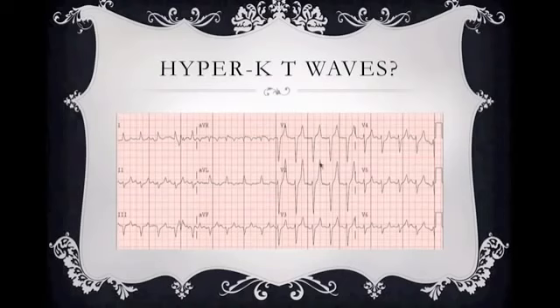Also looking at this T wave, we're noticing another thing. We also notice that we have a slurring up here of our ST. It's not flat, it's not straight across. And my T waves are symmetrical, meaning my upstroke and my downslope are symmetrical to each other. Symmetrical upstroke, downslope, pointy, very pointy T waves, peaked T waves as they're called, are very classic for hyperkalemia.